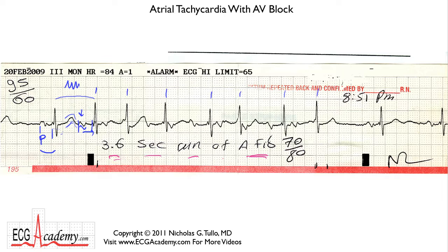Now let's look at the next T wave, the T wave of this QRS complex. What does it look like? It certainly does not look like this T wave. It's got this really deep, sharp-looking squiggle. It's almost like a shark came by and took a bite out of it. And if I get rid of some of my annotations here, I think it's safe to say that this signal right here looks a lot like this signal right here. So sure enough, this is another P wave. And what's the rate? The rate's about 150 beats a minute.